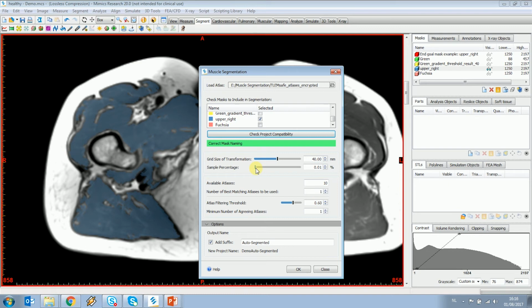Now this parameter has a considerable effect on the processing time. Therefore, caution is advised when increasing this parameter above its default value, which I believe is 1%. Setting the parameter above 50%, and even above 20% or so, is hardly ever needed. So I would suggest experimenting with it between 1 and 10% or something like that.